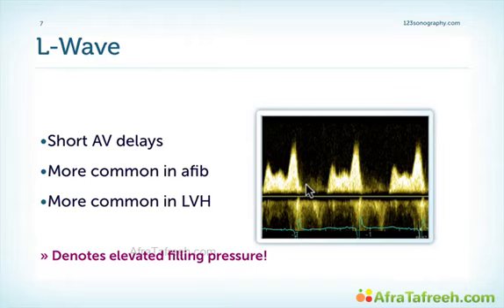If you have a patient who has an E wave which is taller than the A wave, and you're not sure if it is a normal or a pseudonormal pattern, but if you see an L wave, you can be quite certain that it really is pseudonormal filling, because the L wave, as I already mentioned, denotes elevated left ventricular filling pressures.